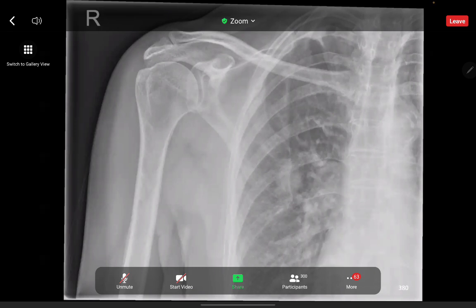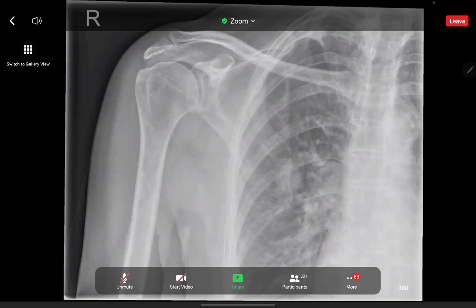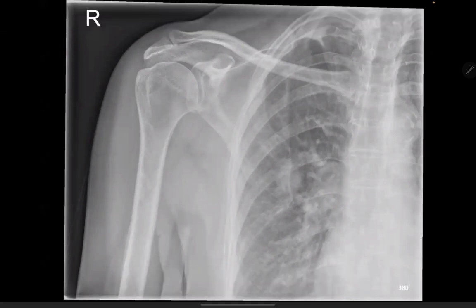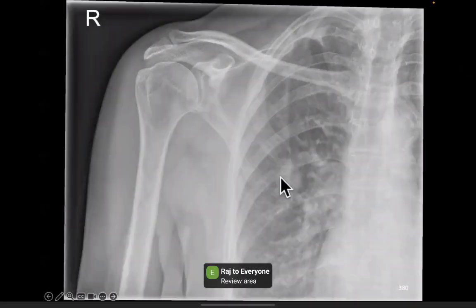When you're looking at the lungs, look at the bones, look under the diaphragm. When you're looking at the abdomen, look at the lungs. You know, it's all basic stuff, but don't forget to do it in the exam. And look for any bone lesions, because then you can upstage the lung cancer if you have spotted it.